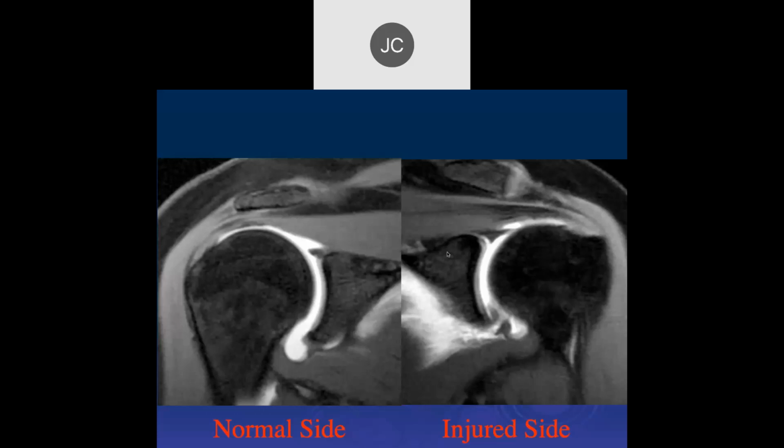So we see that torn tissue near the inferior labrum, and there's some joint fluid exiting the joint. Oh, that there's some joint fluid outside of the joint space, and so this is probably a glenoid avulsion of the glenohumeral ligament.